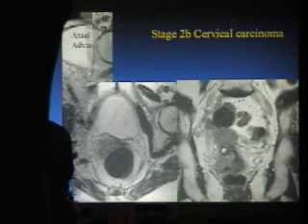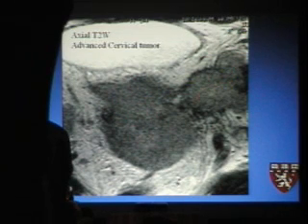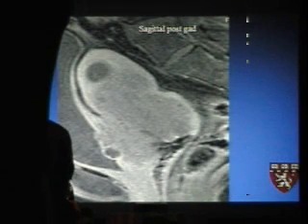the right side here. And more advanced disease, clearly lymph node metastasis can be easy to diagnose when they're this big. The reason I show this is to look at the lymph nodes when they're even small and see if the signal intensity matches that of the primary tumor, and it will help you in diagnosing metastasis, perhaps in a micrometastatic mode. That patient, same patient in the sagittal view, showed extensive bladder wall involvement as well.